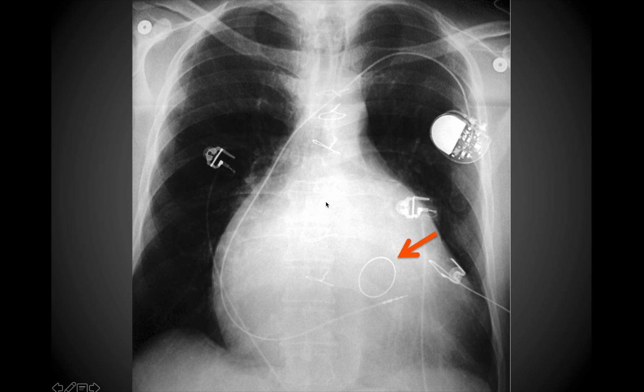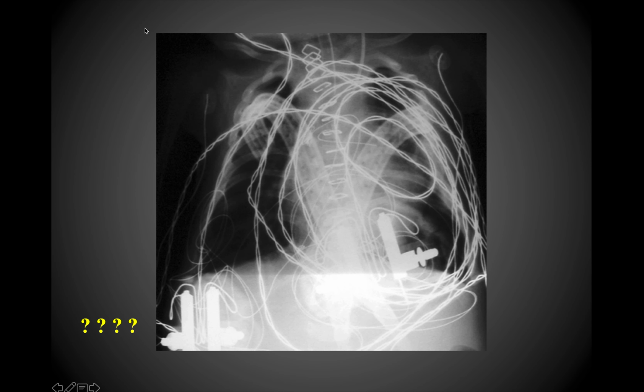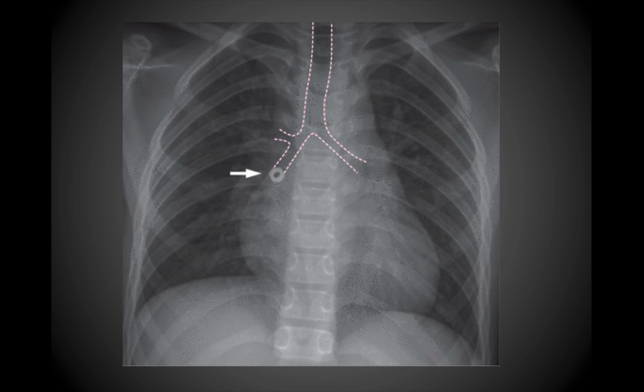You can also tell that they've had open heart surgery, where you can see here where the chest has been wired back shut after the procedure. These are also cardiac leads that you see on either side up there. This is actually an infant right here, so you can see they have an immense amount of hardware on them. They have bilateral chest tubes. Their chest has been wired shut again, so you can see these are all staples going down the center of their chest right here. They have an external pacemaker placed on them as well. So a lot of hardware placed on this patient, which makes it really challenging to be able to appreciate the structures of the chest.